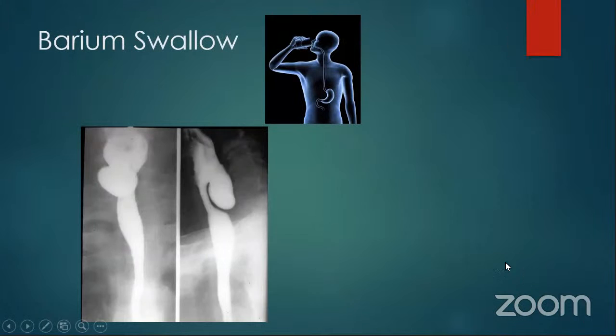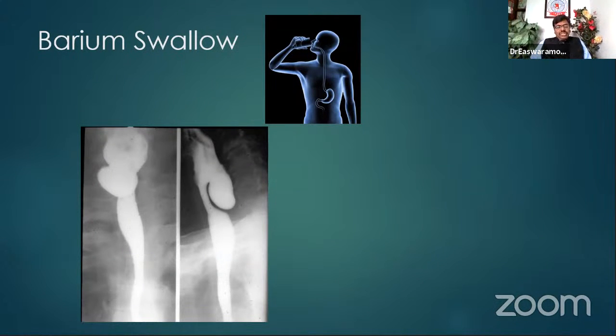Next, this is a patient, an elderly person who came with intermittent dysphagia and food sticking in the throat, halitosis, that is foul smelling breath. And we did a barium, and this is what we found. What could be the diagnosis here? Anybody wants to give an answer if I ask? You want me to name somebody, or anybody wants to? I'll ask Karthikeyan. Would you like to try?